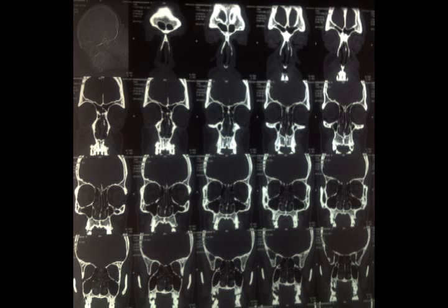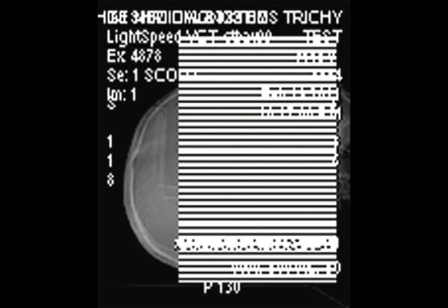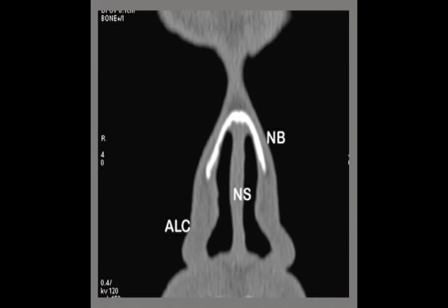Now this is a CT scan, paranasal sinuses, coronal cuts, bone window setting, 1 mm slice thickness, the gantry view showing. The gantry view gives 2 facts: one, the positioning of the patient, and second, the slice thickness. Sometimes you might space the sphenoid more, 3-4 mm apart, and the frontal might be 1 or 2 mm, so you have to specify.